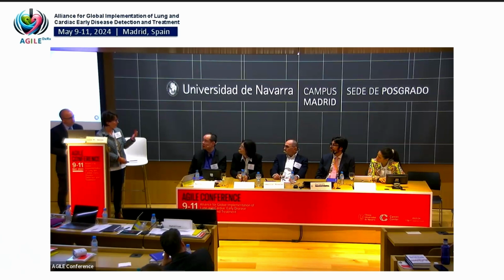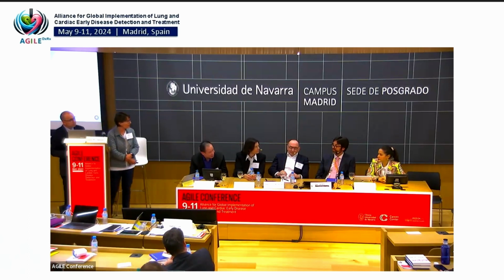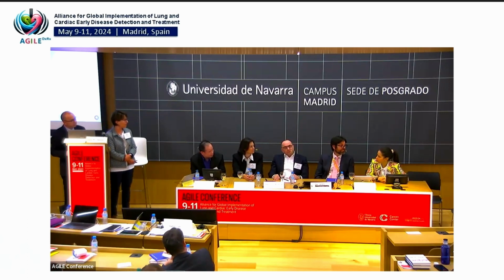Okay, anyone else from the panel? For the first case, it looked like it was coming and going. Is that correct? Because they were 1 month apart, and the lesions that were there before disappeared. No, it's 2 different patients. Oh, 2 different patients. Okay, similar finding in two different patients. Okay, because there are different dates also. Right. Okay, different patients.